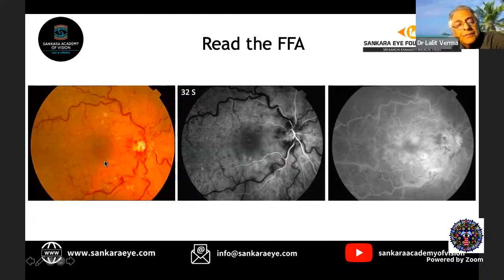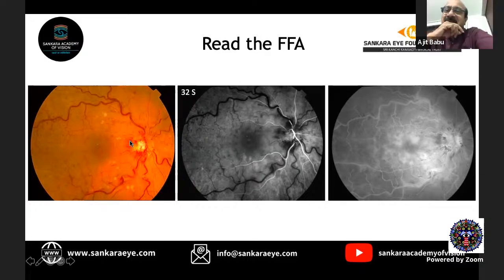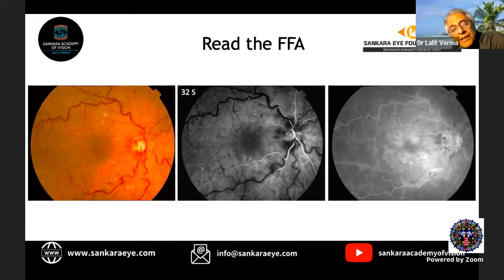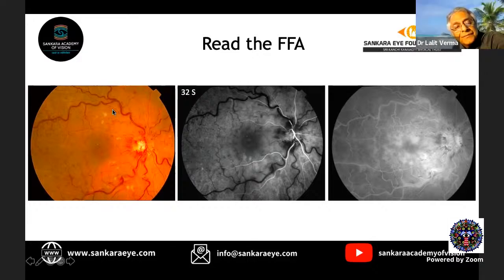Don't jump. Not only hyperemia, if you are seeing the disc, comment on whether the margins are clear or not. You describe that: the nasal margin is clear, but the temporal margin is not. And it's tortuous veins; the arteries are not tortuous. Actually, there is a narrowing of the arteries. Also comment on the AV ratio, because the normal AV ratio is about 2:3. Here the arterioles are narrowed and the veins are dilated and tortuous, so maybe it is 1:4 or so.